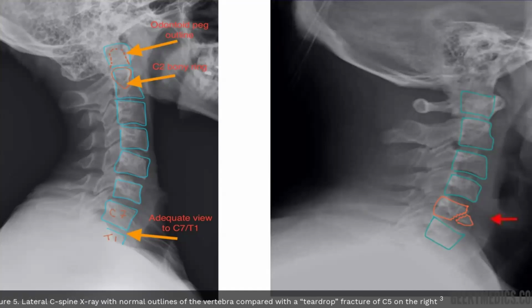Sir, it is not accurate because the patient name and address are not given, so the information is not there. Also, the lateral cervical X-ray is not written here. The patient name, age, ID, date and time are not there, so it is not accurate, right? Yes, sir. What is this fracture?